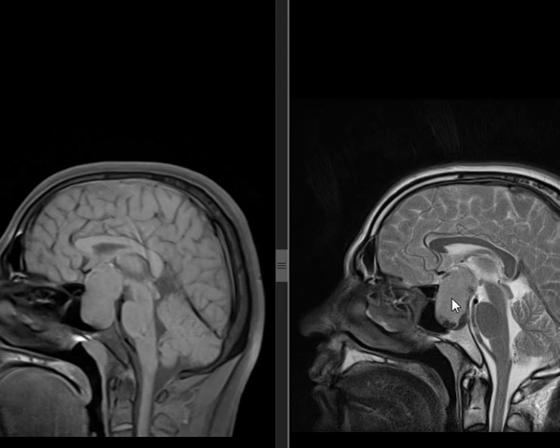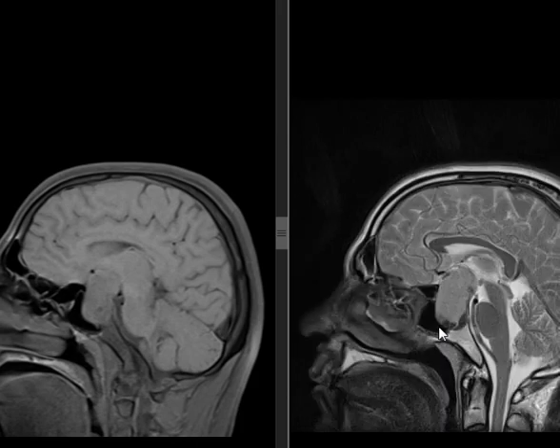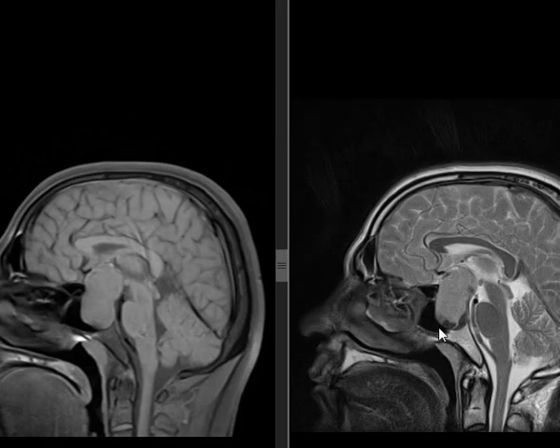So the enhancement of the lesion itself is not necessary; it will not provide important diagnostic information. What's important here is to detect any encasement or invasion of the surroundings, as it will determine the course of treatment.